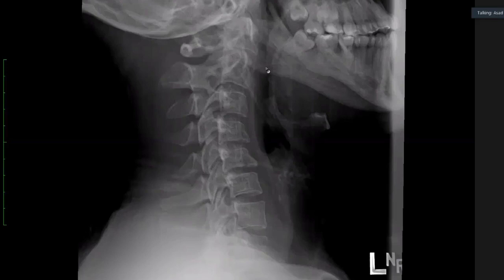Good. And if I just remind you, we've just seen her CT head. On CT head, there was nothing intracranial, but where was the hematoma? It was a scalp hematoma, but where about in the scalp? It was on the parietal region, top. It was at the higher convexity, straddling. Yes, vertex, exactly. So how would this patient have fallen?